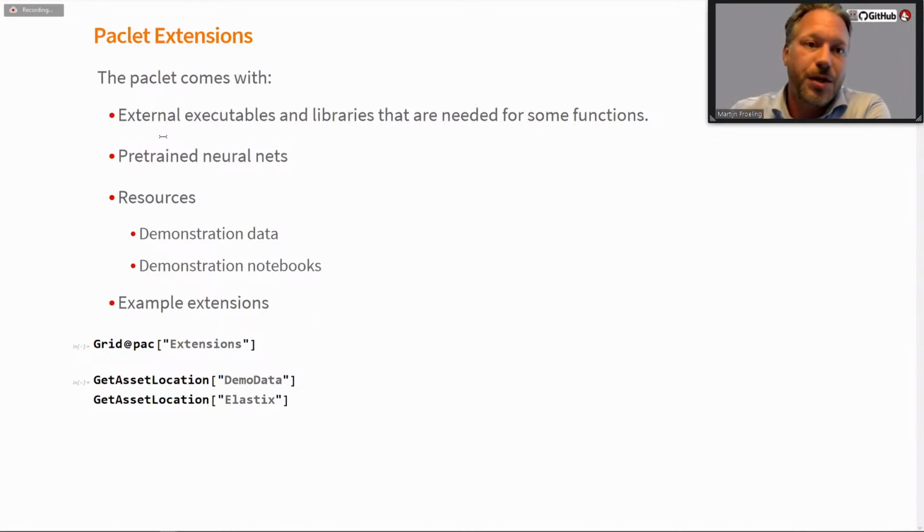So it's not only functions. Actually, the Paclet also comes with some packed-in external executables. It's software that I use, written by other people, that I can call from my main toolbox, so I don't have to leave Mathematica to run some of the external packages. Since this summer, it also comes with some pre-trained neural nets that I will show later.